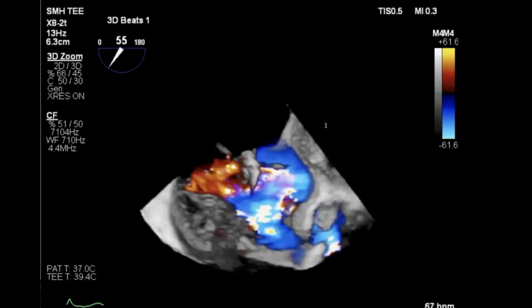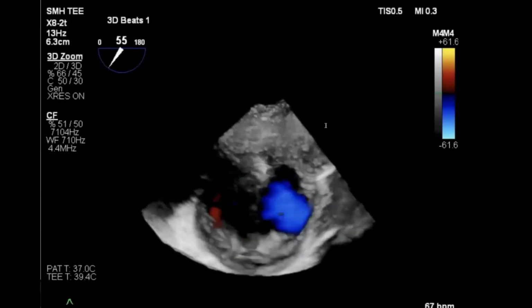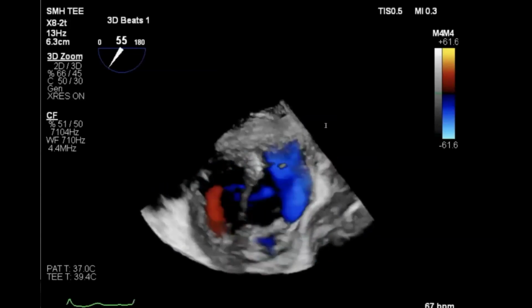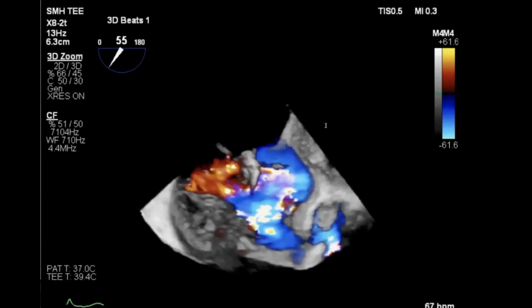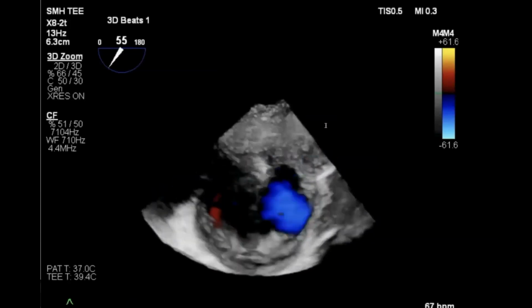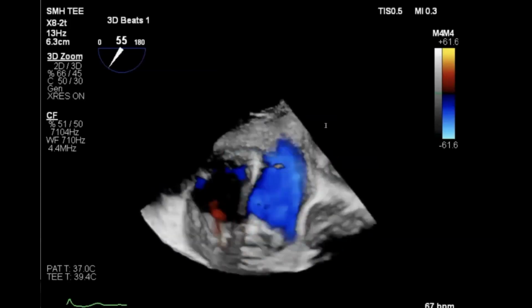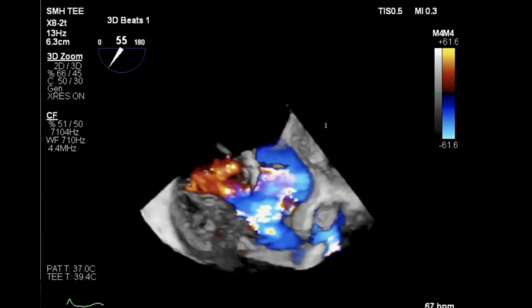So I think the bottom line is knowing how we image this in TE can really help when you see a lead in transthoracic. Using those same tools, zoom in, sweep, trying to show the leaflets, trying to show the full lead in a straight line can be actually really helpful and help us make predictions and actually direct our TE as well.